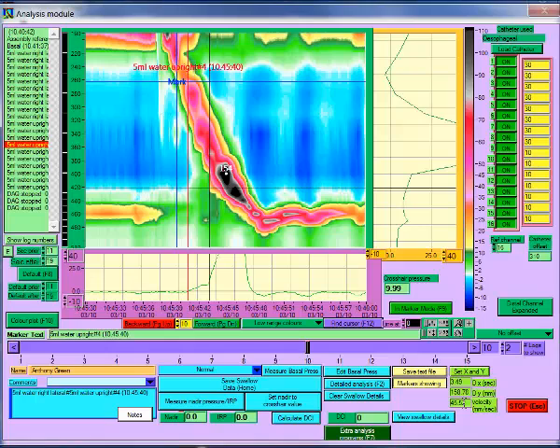This is useful for determining the velocity of a contraction or the difference in time or distance between 2 points on the screen.